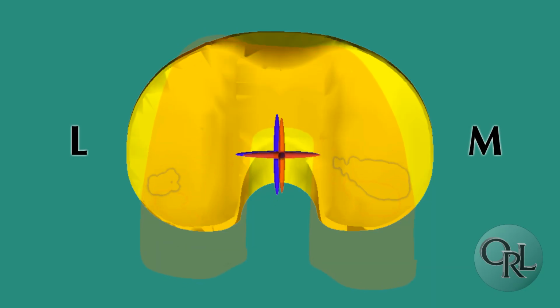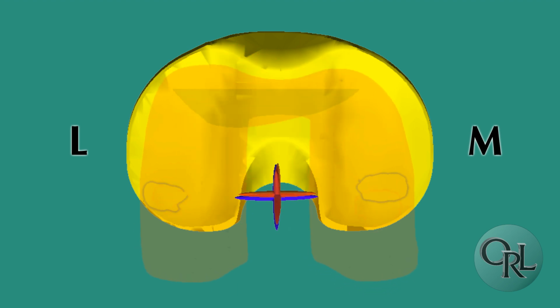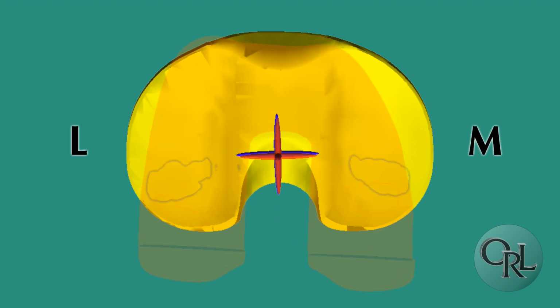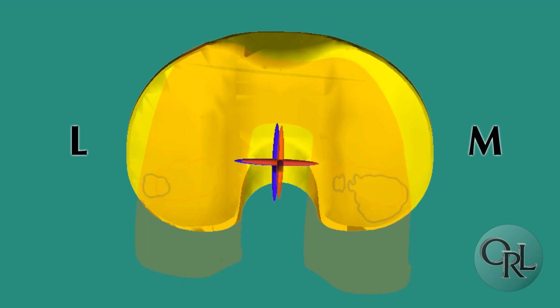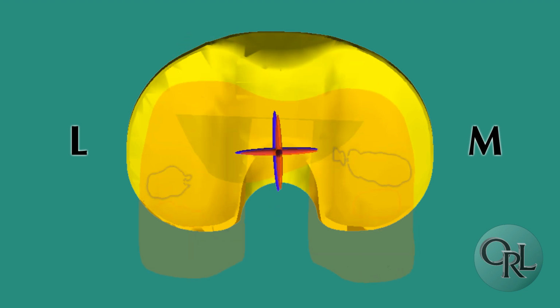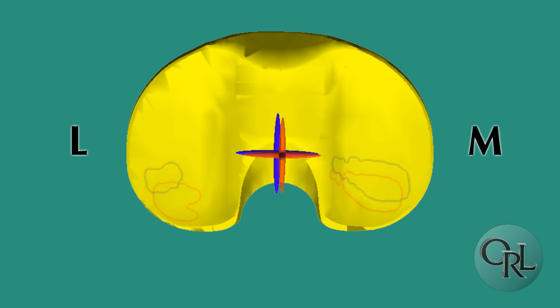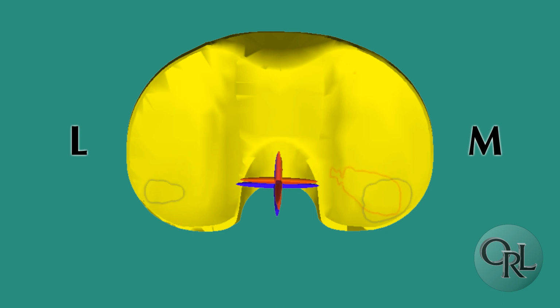The motion of the kinematic aligned femoral component in orange can be observed during walking gait. The orange jack is rigidly attached to it, allowing a simplified representation of its motion for easier comparison to the mechanically aligned femoral component jack in blue. The progression of tibial femoral contact areas in both the medial and lateral compartments can also be compared. Kinematic alignment in orange, mechanical alignment in blue.